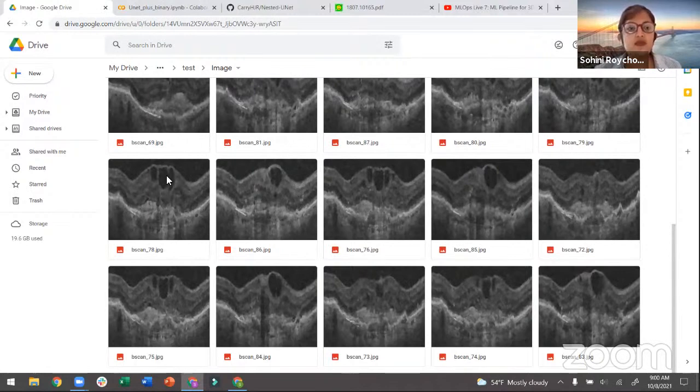And ideally, if you have regions of interest such as this, so these are called the retinal cysts, which you need to segment for. But if you just segment per image, then that's not enough. You typically require the cysts in multiple images to be segmented so that you can reconstruct the volume of the cyst. These cystic regions are filled with some fluid, so ideally you need to figure out the volume of fluid in these particular cysts so that your prognosis or your treatment process can work accordingly.